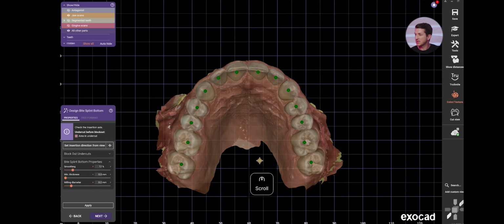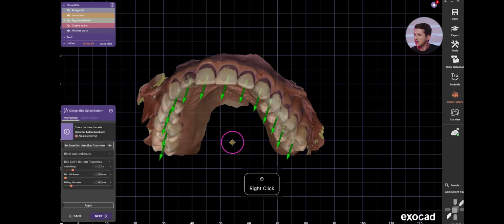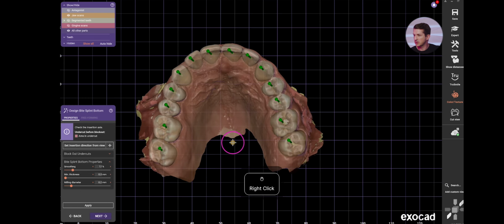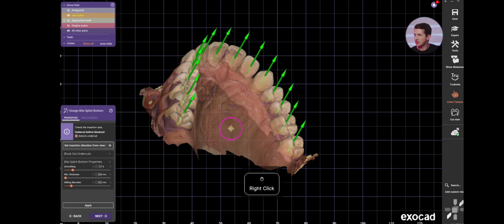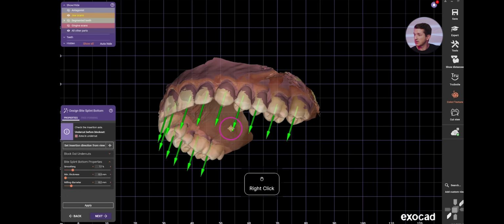So the last thing we're going to do here is determine what our insertion path looks like. And so for me, the insertion path here is actually rather good. I don't know that I would change it. There's a nice split between buccal and palatal coverage. It looks really good. What I'm checking for on the buccal is that I don't have a lot of wax past the height of contour. Once we move posterior, we have some, and that tends to always be the case just because of the change of angulation of the teeth back there.